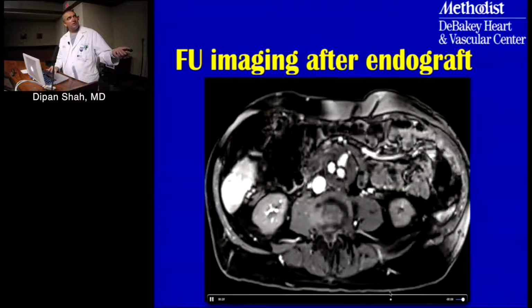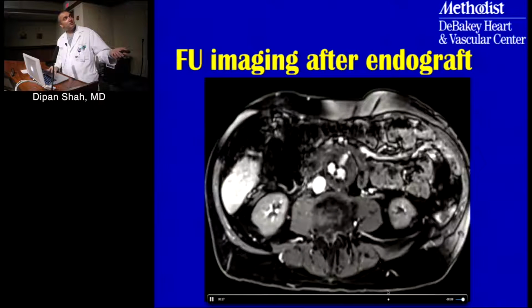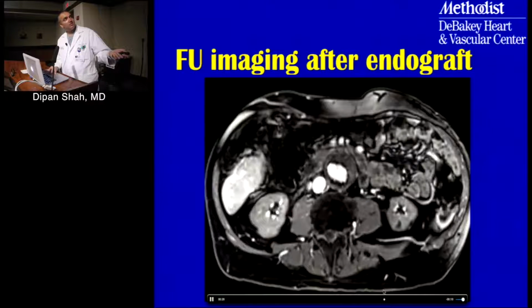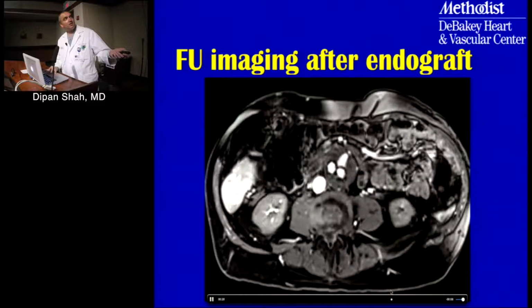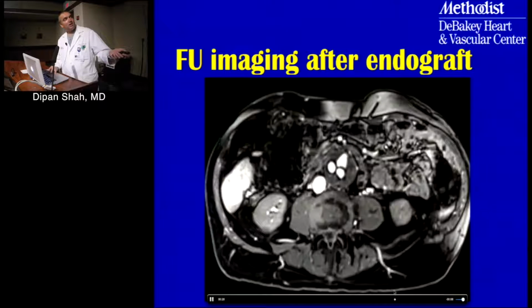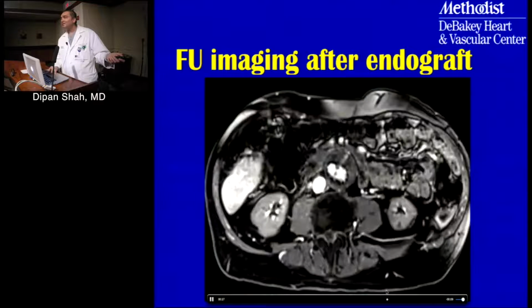Now the question is, follow this and see if you can actually see, does this communicate with a branch coming off the aorta? I don't know how well it shows up on the big screen there, but on my screen you can see actually very nicely there's one branch coming off right here. Right, so obviously this is anterior, so it can't be lumbars. But this actually is the IMA right there, and this pool of contrast seems to be communicating with the IMA itself.